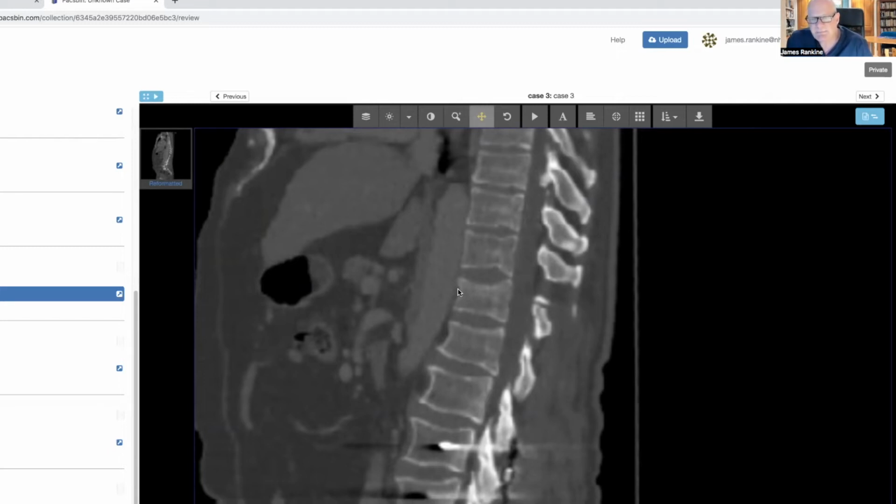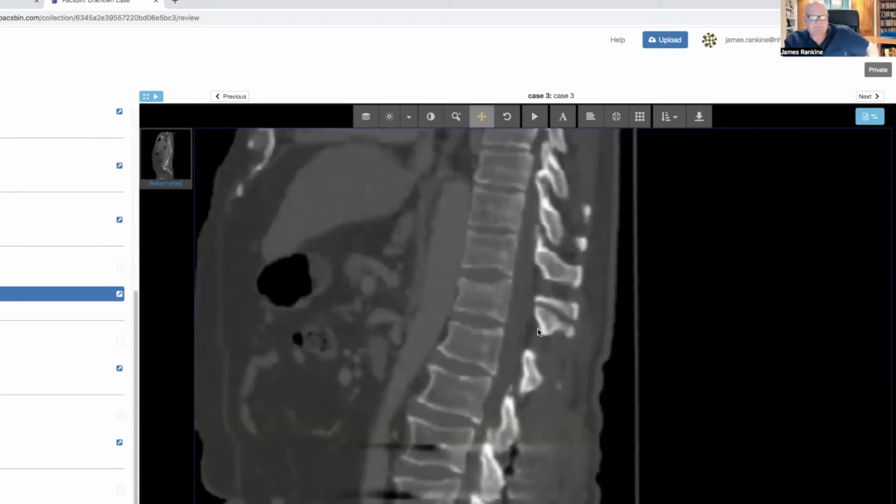And there's a basic principle when it comes to spinal trauma, and in fact, not just spinal trauma, it applies elsewhere in the body as well: the greater the degree of bony disruption, such as in the case of the burst fracture, the less likelihood that you'll have ligamentous disruption. And the feature of the flexion distraction Chance type injuries is that you often get very little in the way of crush of the vertebral body anteriorly. This principle does apply to other areas of the body.